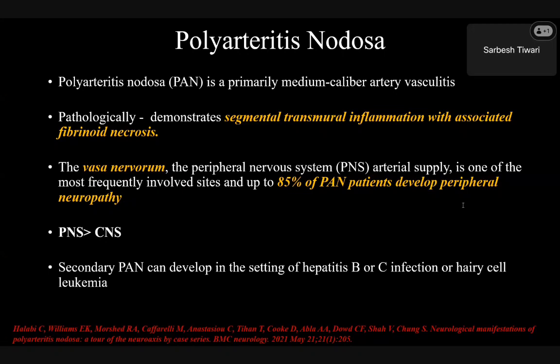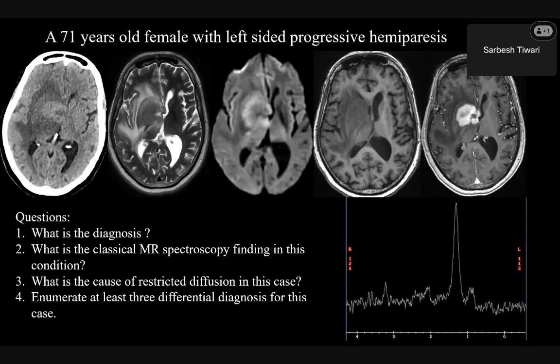So Ravi Raj is saying it is a lymphoma. All right. Any other differential, any other mindset over here? And I've given you a spectroscopy also. Apart from Ravi Raj, Karan also feels it's lymphoma. All right. Anybody, any other alternate diagnosis, or you want to put a differential diagnosis here? Are you very sure? So everybody appears to be quite sure that it's a primary CNS lymphoma.